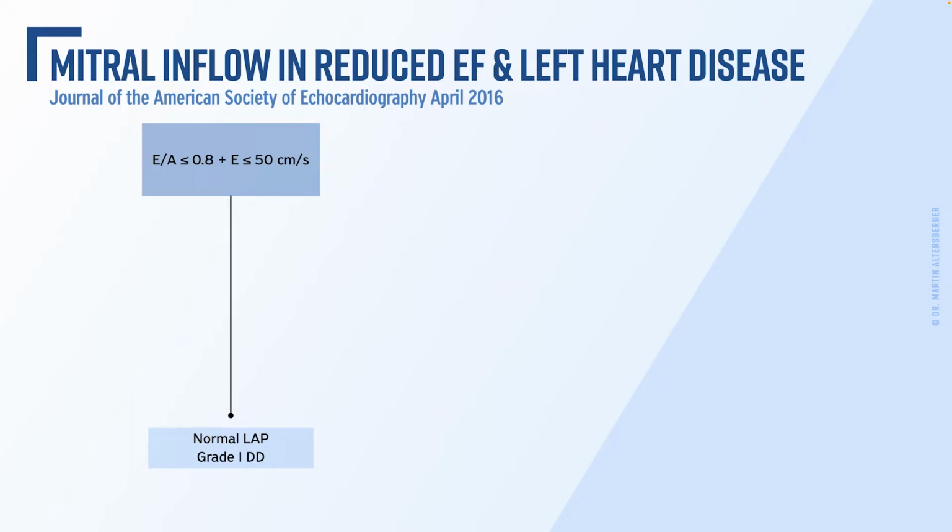And when this situation occurs, we first have to take a look at the E to A ratio. In the guidelines, if the E to A ratio is below or equal to 0.8, plus the E wave below or equal to 50 centimeters per second in a diseased left ventricle, for example, in patients with hypertrophic cardiomyopathy, amyloid heart disease, it doesn't matter, so also in patients with heart failure with reduced ejection fraction, when you have this constellation, the left atrial filling pressures are highly likely normal.